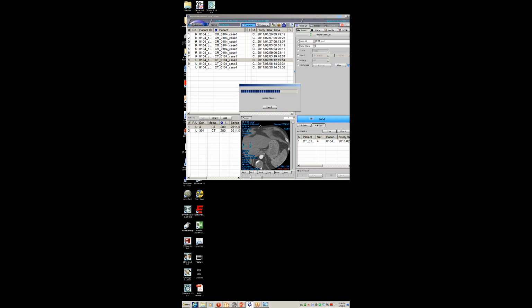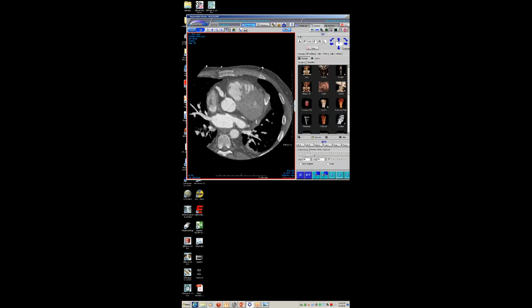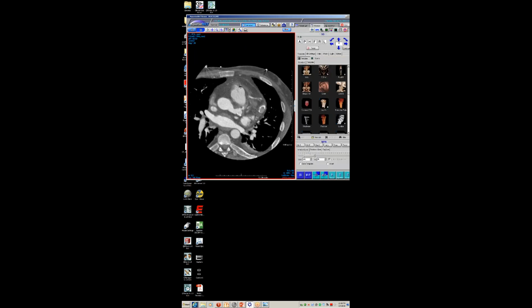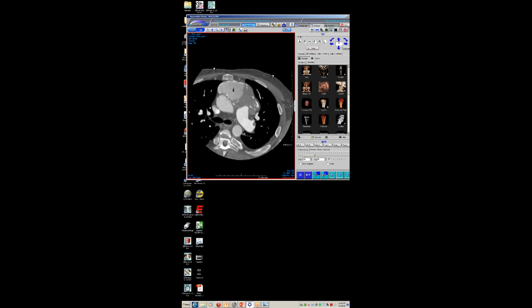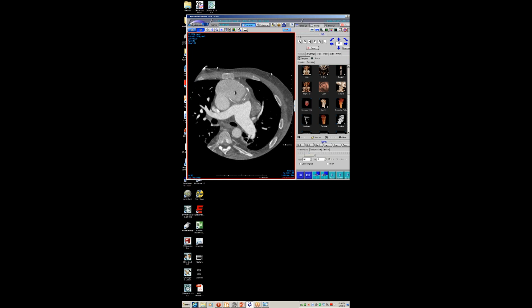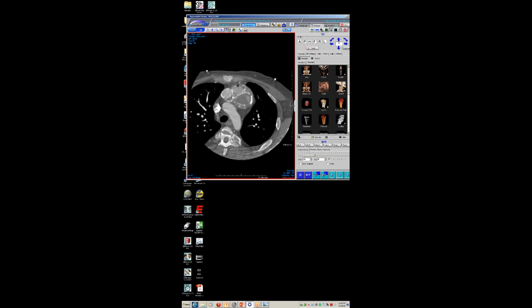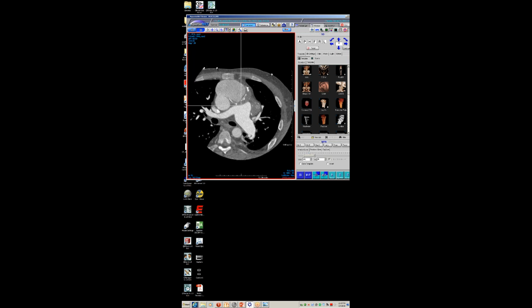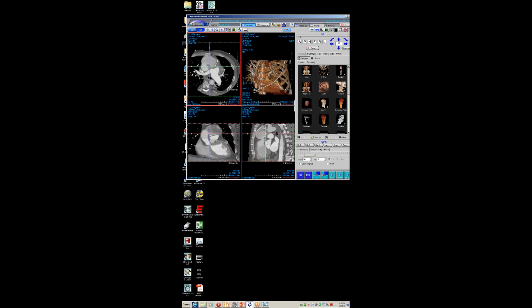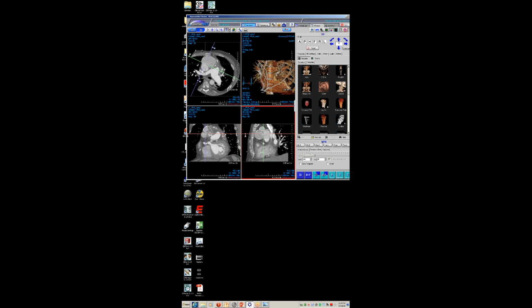This is just a quick case because it's just impressive. Another older case of a patient with atherosclerotic disease related aneurysms, and also a very nasty looking saphenous bypass graft with this huge defect in the aorta, presumably at the aortotomy site, with this massive, partially thrombosed saphenous vein graft. And I'm assuming part of this is a pseudoaneurysm. It's really hard to tell.